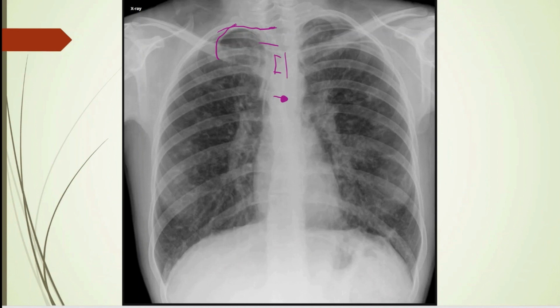above that. Now this patient has a central line here. You can see it's coming right here, and the tip ends right there. So it looks like it's probably a little bit below the carina, but still above the cavo-atrial junction. So it's appropriately placed. You can see it is vertical, so it's not horizontal or up against the wall. And if you wanted it for long-term use, you could probably put it down just a little bit further to the cavo-atrial junction. But I would be happy with that placement.